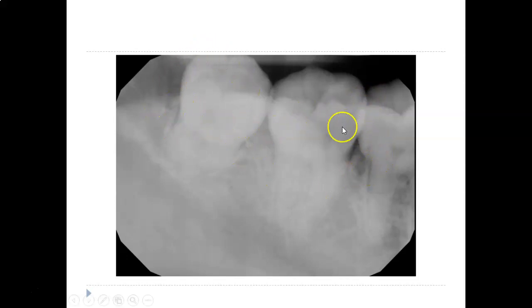They got a lot of horizontal angulation error, and they got foreshortening. You can see things are very distorted here, but you can see the whole tooth and you can see the apices. And so that is still better than having to expose the patient to a whole full mouth bunch of retakes, and then a pano on top of it. So we'll try this out when we can try it on Dexter, or we'll try it when you have an opportunity with a patient with a small mouth.